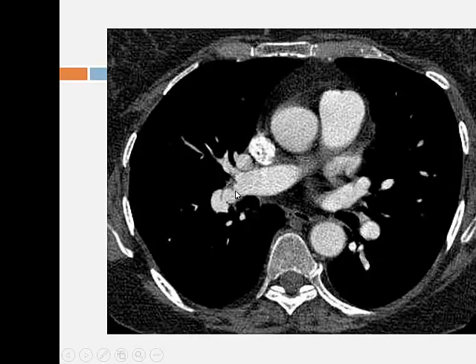Okay, so do you see here, you get this very abnormal, very twisted vessel, and that's basically where you've had thrombus, it's partly recanalized, got a little bit better, but forms scarring and fibrous tissue, and it scars, and it just distorts the vessel and twists the vessel. So what the surgeon does is he sticks in a probe and picks away at it.